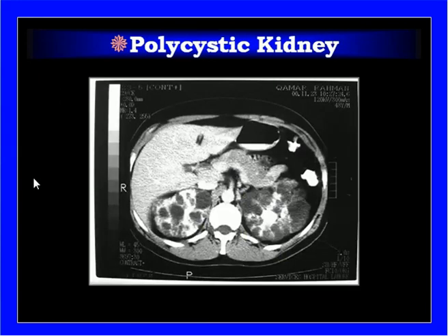Axial image at the level of the kidneys, you can see the pancreas and the liver, and both kidneys are moderately enlarged with bilateral cystic lesions of variable sizes. Contrast was given and the contrast is taken up by the normal parenchyma which is left.